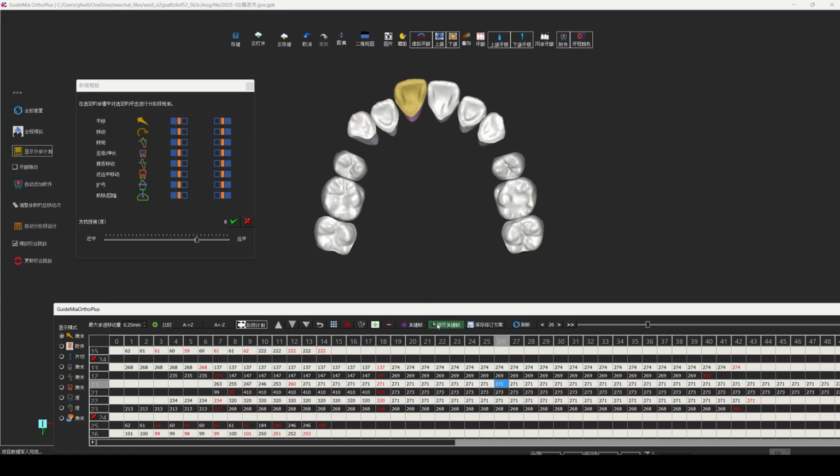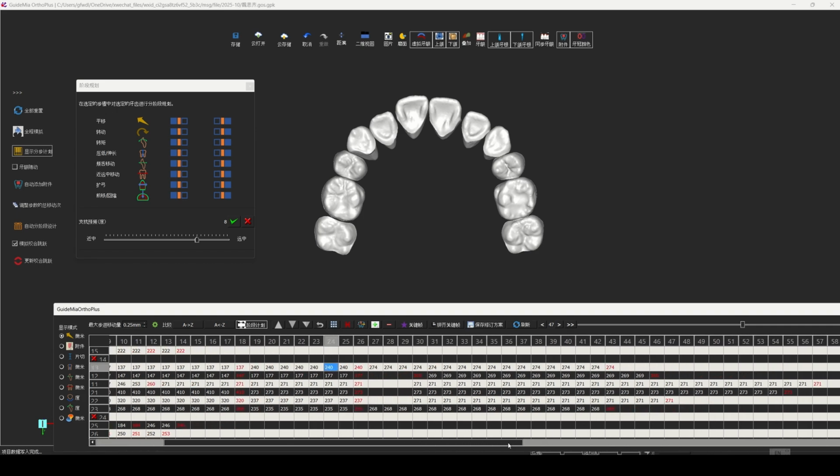So at a certain point, like here in step 26, we define a keyframe for this tooth number 8 or 11. Then we align all the other teeth according to this keyframe. Now you see they are in an aligned position. The way we are doing this keyframe alignment is that during the entire movement, we don't have large gaps between the anterior teeth. They remain in a good alignment and in a good aesthetic shape.